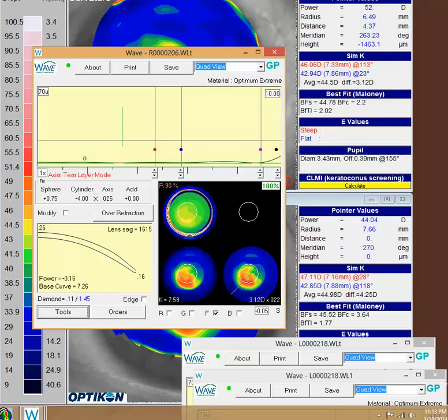You've got a very, very exact freeform back surface of the lens. And if you remember what this will do, freeform is going to try to put a nice, basically freeform toric lens on the curve on the back side of the lens, and then it's going to try to incorporate this data into that lens to create the perfect lens for this irregular cornea. Well, if this is not accurate due to a funny cornea, you're going to end up with a weird power throughout that lens. And so what I found sometimes, if I'm not sure on this thing, I've just taken this right out of the equation.